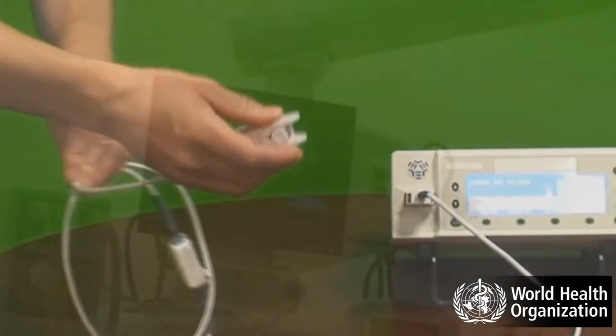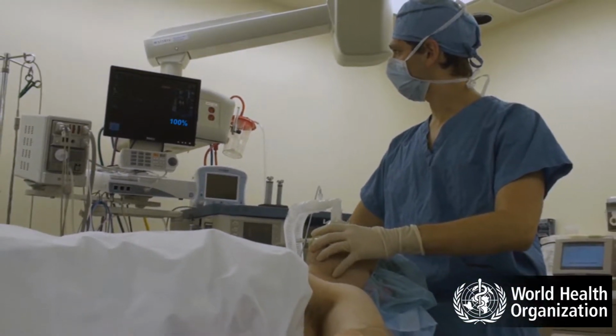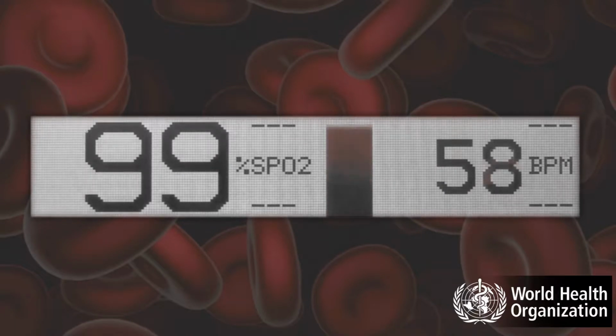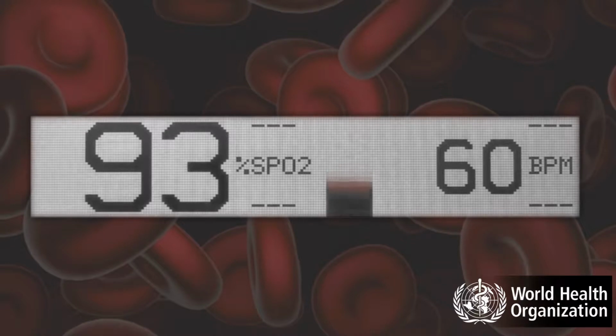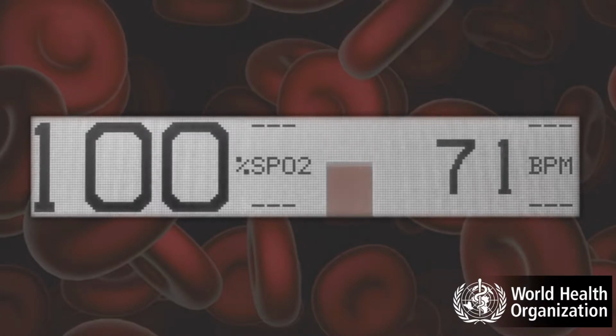During use, the monitor updates its calculations regularly to give an immediate reading of oxygen saturation and pulse rate. The pulse indicator is continuously displayed to give information about the blood flow. The audible beep changes pitch with the value of oxygen saturation and is an important safety feature. The pitch drops as the saturation falls and rises as it recovers. This allows you to hear changes in the oxygen saturation immediately, reducing the need to refer to the monitor.